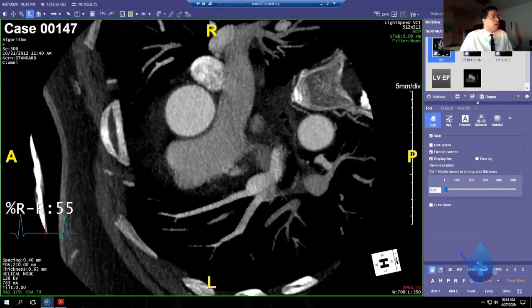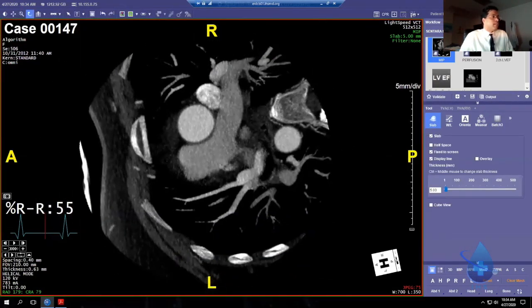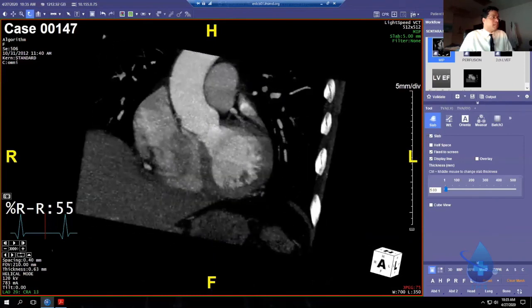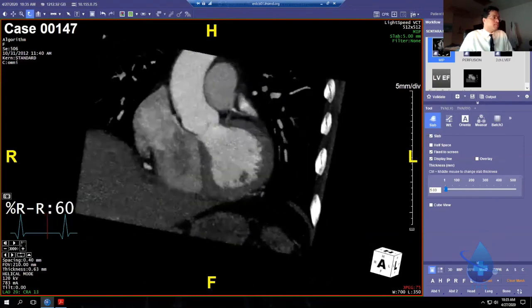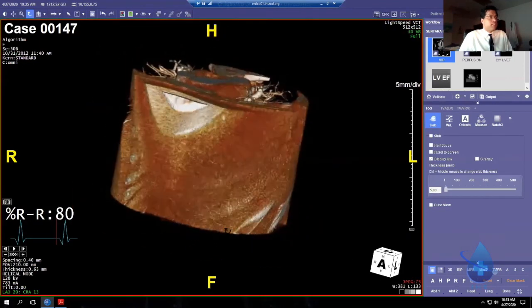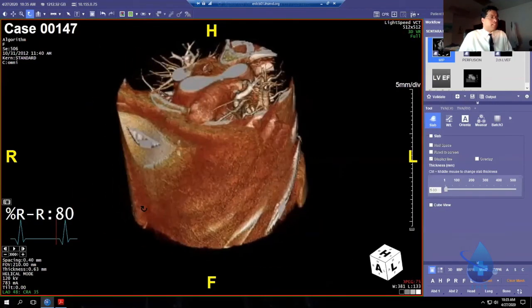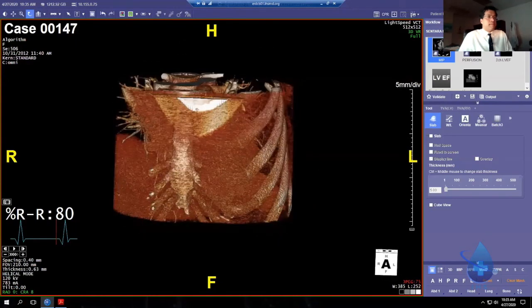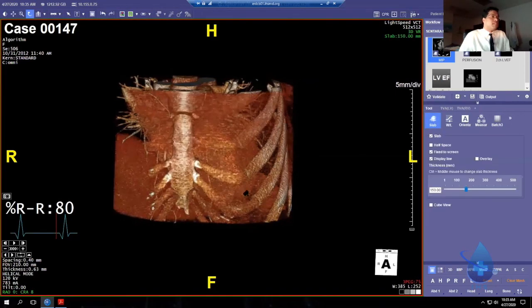All right, now what we're looking at here is called a 4-dimensional workstation. And this is the main TerraRecon software that you're going to use. And this is the buttonology that I'm going to teach you. What you're looking at is a CT data set in 4 dimensions. There's a number of buttons. In fact, there's way too many buttons. It's one of the busiest.